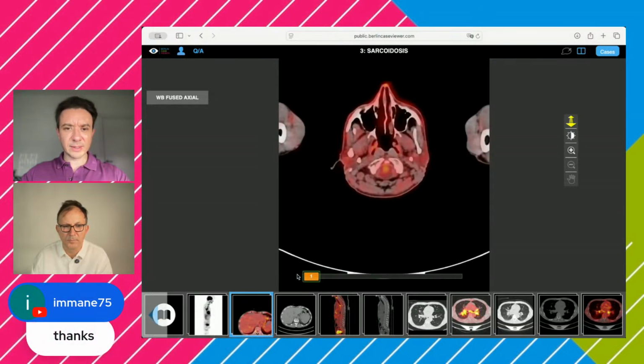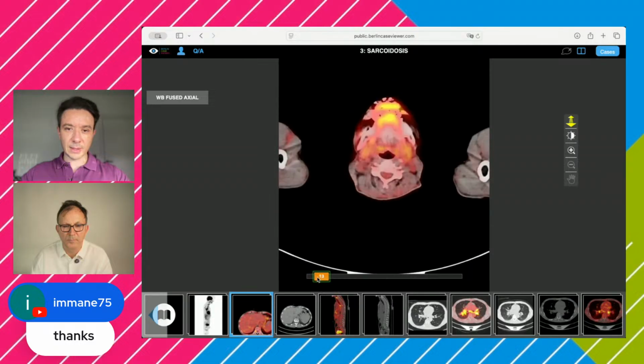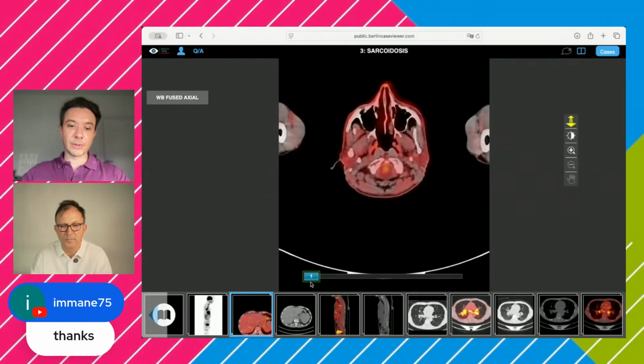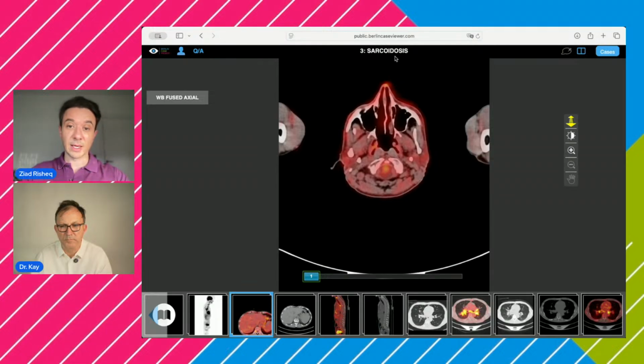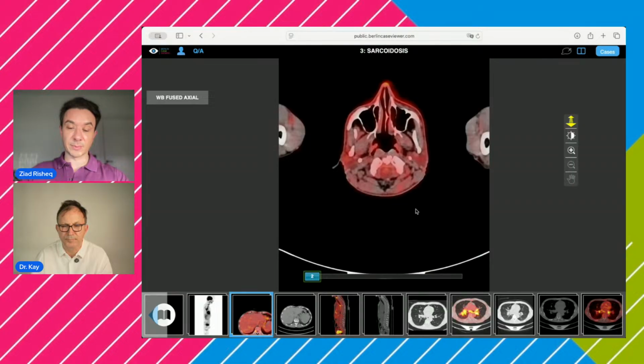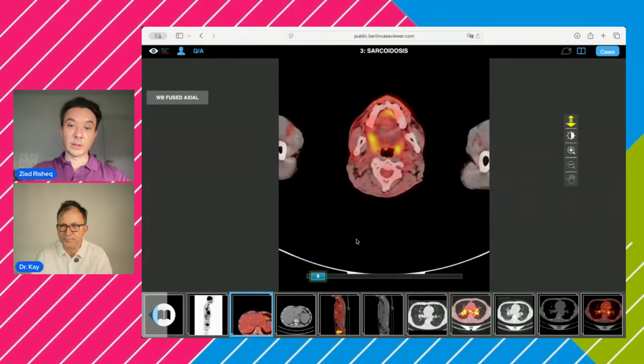The salivary glands look fine. I don't see any uptake in the salivary glands, and you have to look also, but they're not included in this case. I'll upload the other case. And you have to look at the orbits, especially at the rectus muscles, because they can be involved, and you should assess them for asymmetry or soft tissue fullness in these cases, especially in sarcoidosis.